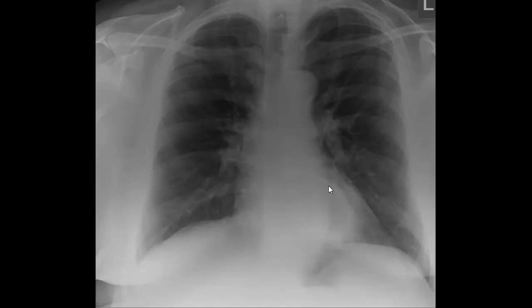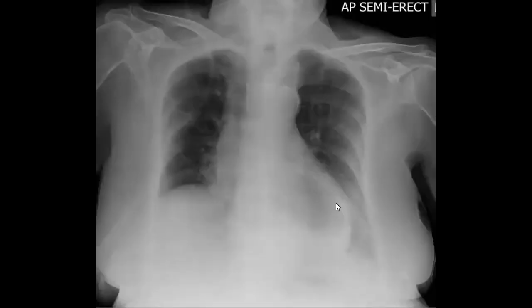Retrocardiac, perfect. There is retrocardiac density. In the first, common is common. With this air fluid level, which is very subtle, you can think about either hiatus hernia or abscess. Yes. So hiatus hernia, Nis Isa, perfect. Nice. Hiatus hernia, Ivan, perfect. And this is maybe another example, which is much better for you. Retrocardiac opacity. Yeah, that's good. Nice.